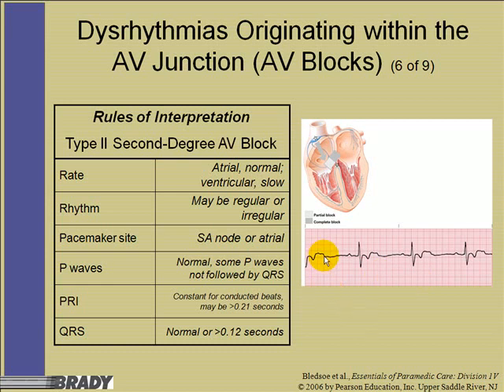So here's a P wave, no complex. Here's a P wave that's lengthened, the QRS complex, a T wave, and then here's another P wave, no complex. P wave, no complex. P wave, no complex.